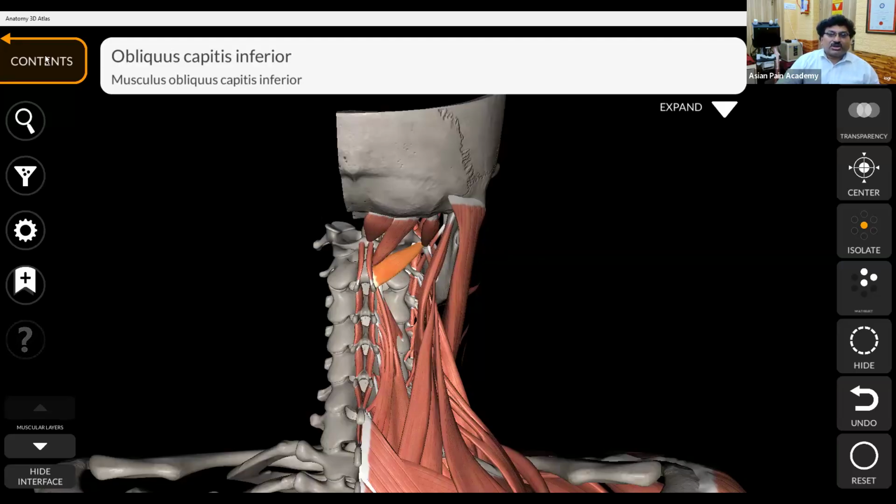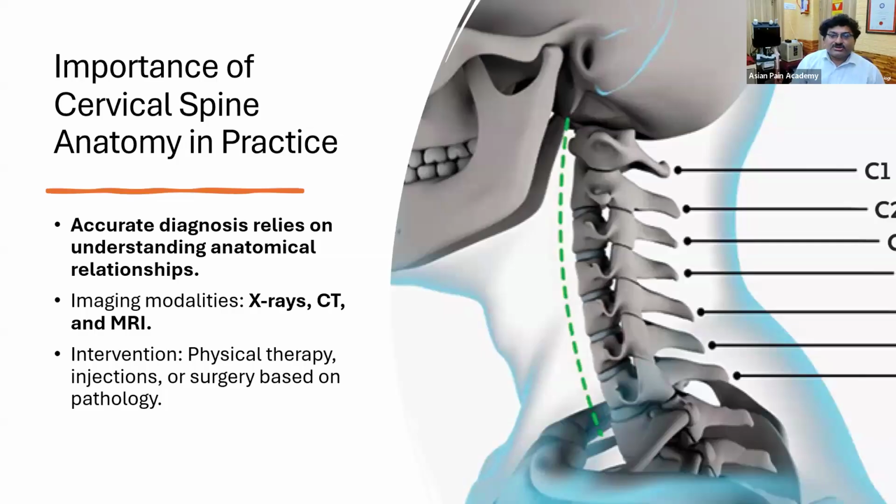Okay, you have already grasped a lot of it, so I am not going to discuss further, because the slide is large and you have to cover everything today. So we'll take time. Let's come to the fluoroscopy.